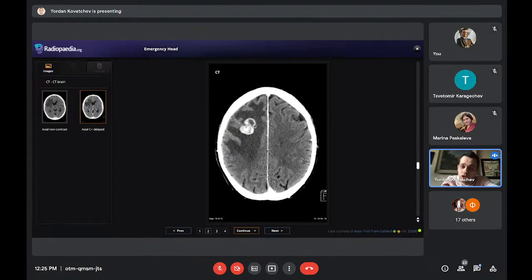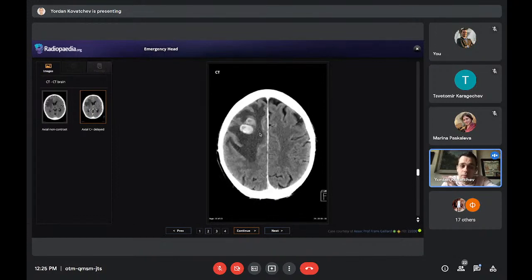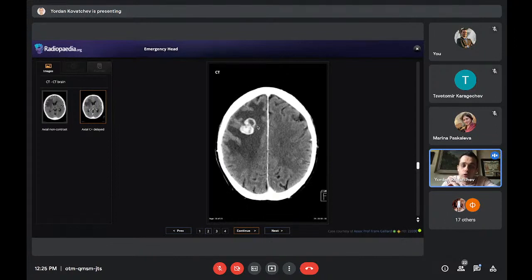If it was 1 lesion, it would again probably be metastasis, but it would also be glioblastoma. This is really the most common. There are many tumors, of course, in the brain, but this is really the most common. The other thing we should consider is maybe there is an abscess going on here, because this is what we call rim or ring enhancement, these lesions.